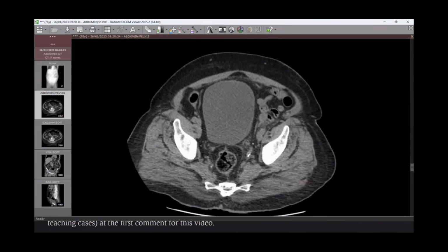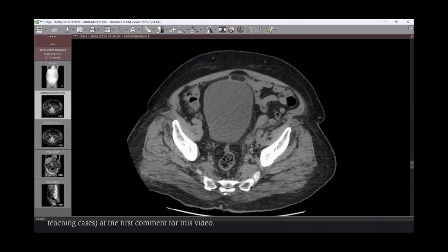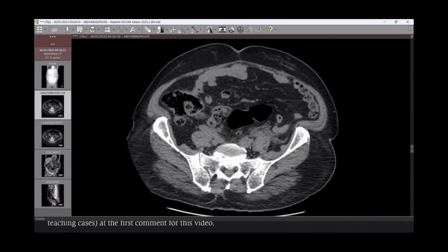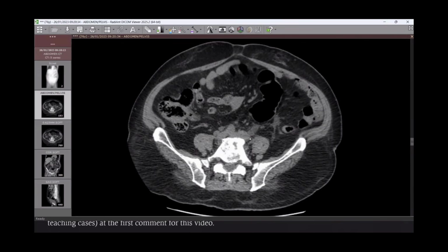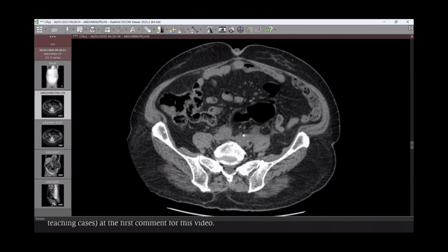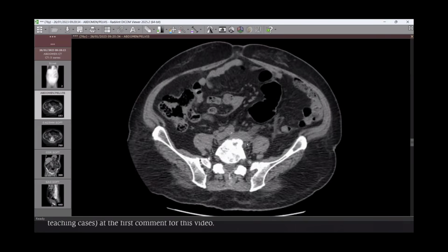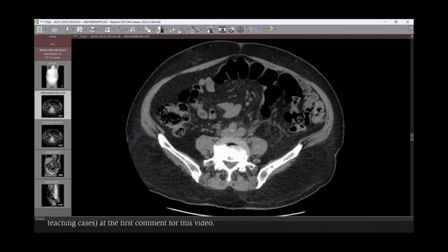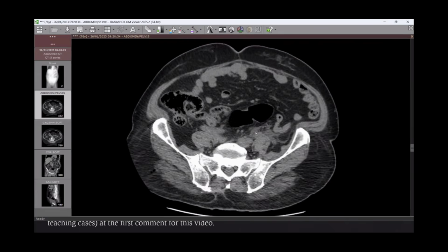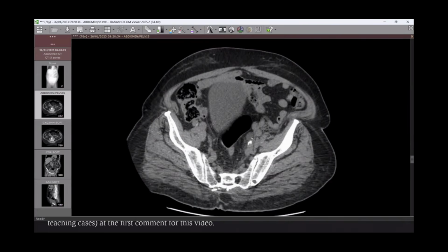After this soft tissue, the distal part of the left ureter is not dilated. This is the point of obstruction, I believe, with some soft tissue and calcific density within it. Is it vascular calcifications? This is linear. This is the dilated ureter. Yeah, now I am tracing the dilated ureter to look for the cause of its dilatation and the level of obstruction.